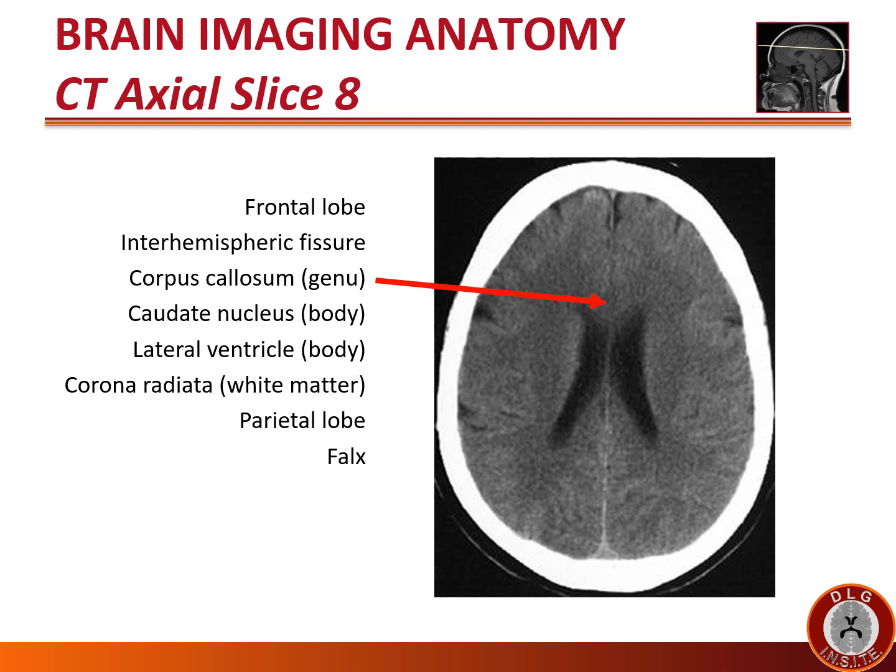Once again, we see the band of white matter connecting the two cerebral hemispheres called the corpus callosum, and the anterior aspect specifically called the genu of the corpus callosum. Note that at this level, one can appreciate the tail shape of the caudate nucleus. The body of the caudate nucleus at this level is easily seen to run along the lines of the lateral ventricle.